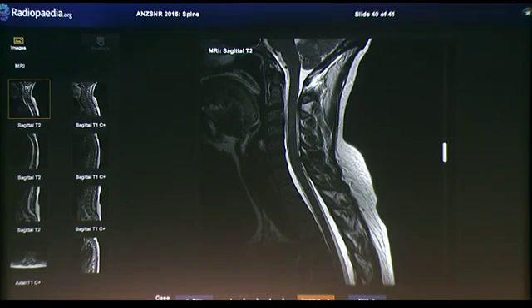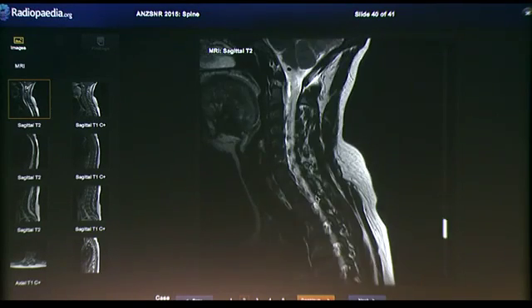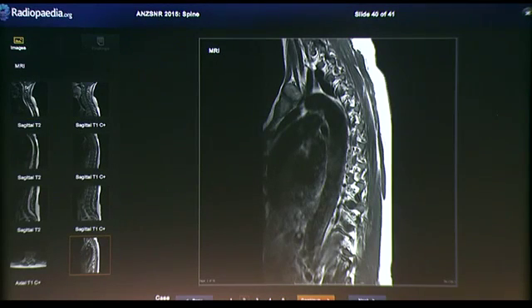So the cause for intracranial hypotension can be a CSF leak from, say, a dural tear, and that's presumably the source of the extraaxial fluid signal. But this is a case to illustrate that even though it's a bland collection of CSF, there can be vicarious excretion of contrast into that space.